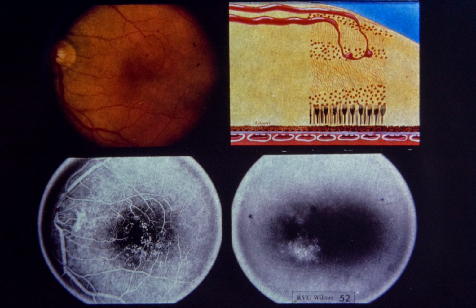Upper right, artist's sketch shows dilated capillaries in middle retinal layers. Lower left, note hyperfluorescence of microaneurysms and dilated capillaries 30 seconds after injection. Lower right, 30 minutes after injection, note cystoid macular edema.